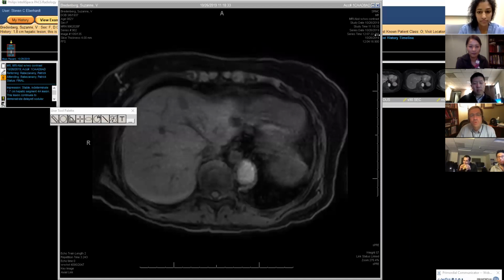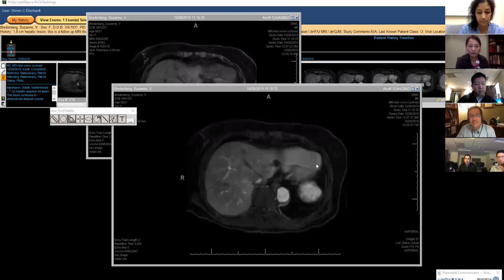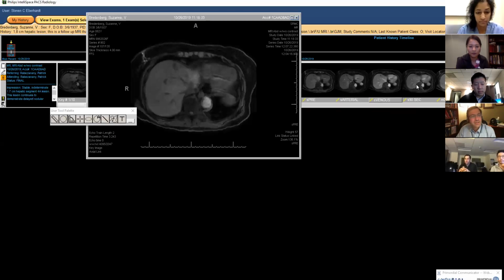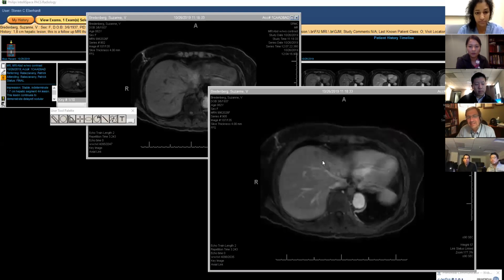And then post-contrast early, it does not enhance. One of the things in the differential would probably be FNH, but FNHs tend to enhance a little bit more convincingly on that arterial phase. This one doesn't. I'll skip the early venous phase and go to about 90 seconds, and we're starting to get some enhancement in this thing, kind of late and slow.